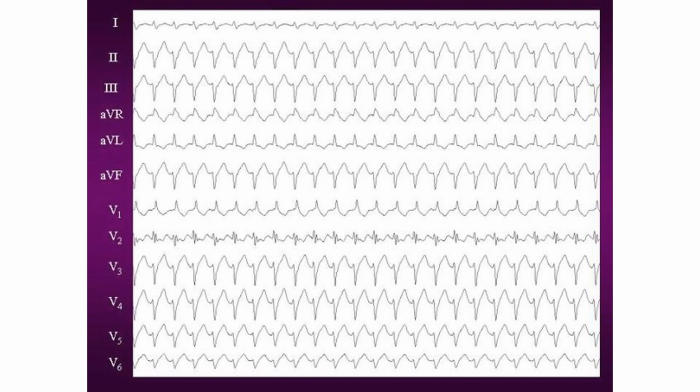Sometimes a tachycardia originating from the scar of inferior wall infarction can also have this pattern. That is one of the differential diagnoses.